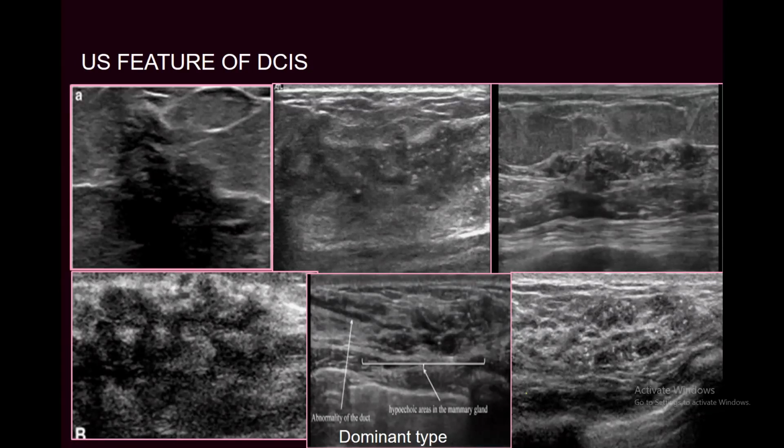All these are ductal carcinoma in situ, and some of them are high grade. And I'll tell you something: the presence of calcification doesn't mean early detection. Usually calcification occurs late. So even late presentation can still be non-mass-like breast lesions.